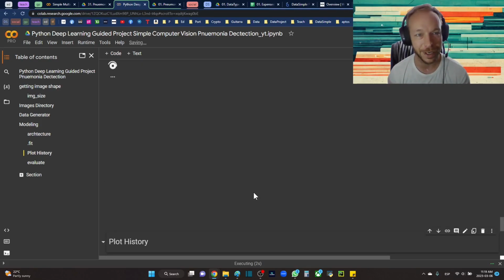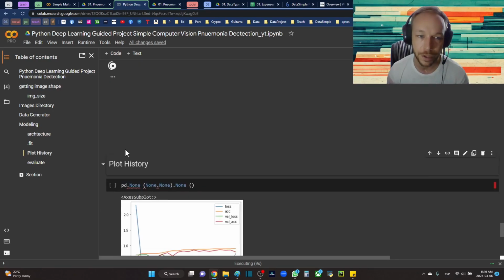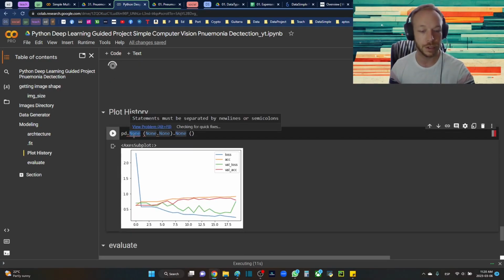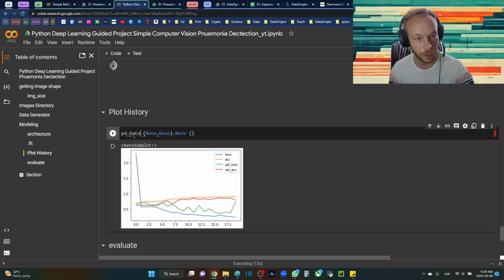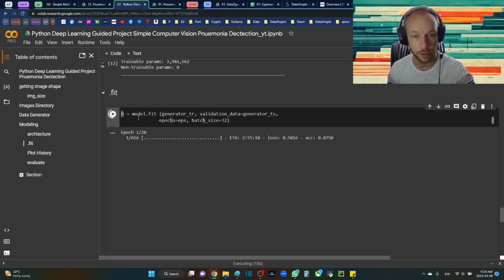It's going to take a while to train, though. I'm going to say quite a while to train. I'm using a GPU right now, even, but it's still going to take a while. So that's starting to train. Just make sure everything works good, and we're going to set up the plot history. So just notice right here when I'm training, I'm going h equals model.fit.